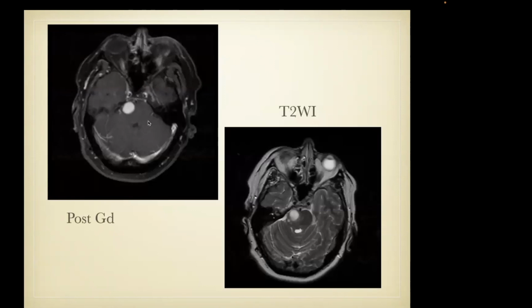Here's the MR scan. It shows homogeneous enhancement without any phase-associated artifacts. The same slice shows you phase artifact arising from the transverse sinus. This is usually a reliable indicator of flow on contrast-enhanced imaging, not visible here. So if we look at this image, we could say this is a homogeneously enhancing tumor, like a cranial nerve tumor can look this way.